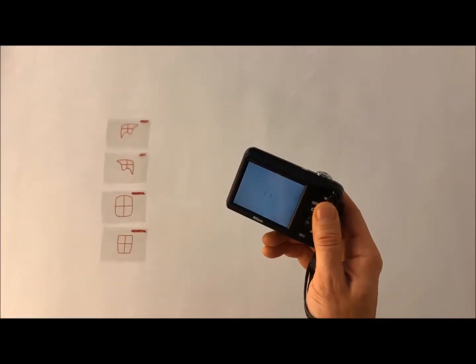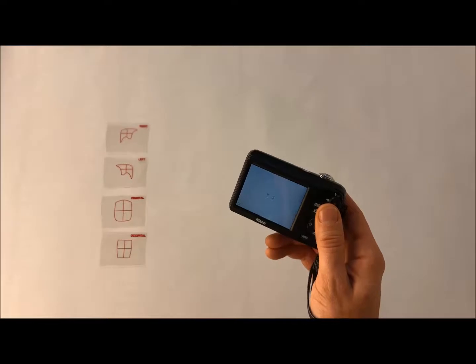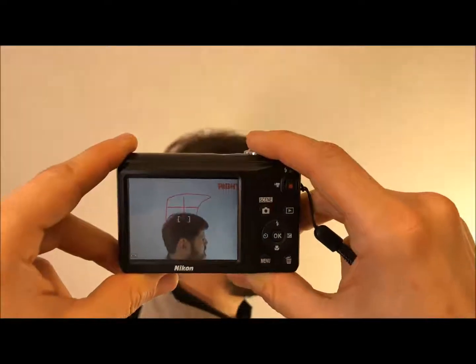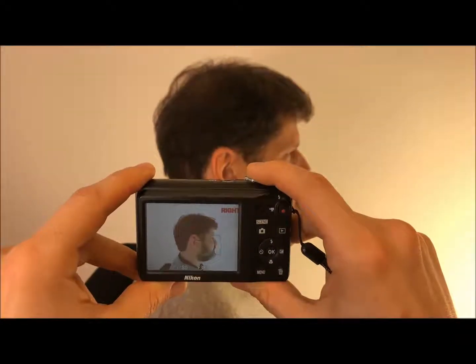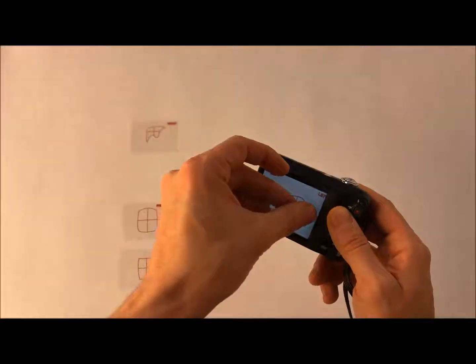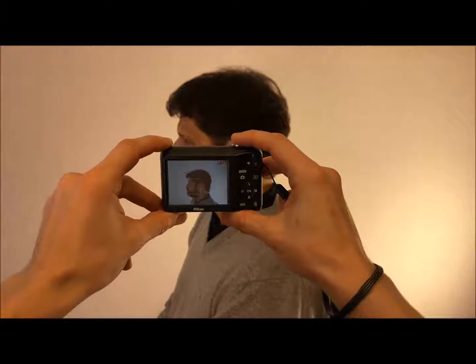On the left side of the screen, you can see 4 different transparent grids reproducing Olsen's diagrams. These grids have been developed to help photographers capture the right angle and position, helping standardize the pictures. Thanks to the grid, the person taking the picture can adjust his position and the angle, ensuring the grid is perfectly superposed to the image of the subject's head.